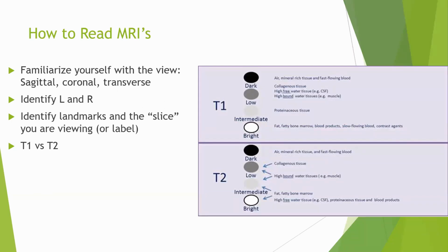So if your patient is supine, and you are standing in the inferior or foot section looking at the patient, then you look at the foot first, then ankle, then knees, hips, shoulder, and the head. That is exactly how the slices are in the MR scan, from inferior to superior. So your left is actually the patient's right, and your right is actually the patient's left. So please bear that in mind.